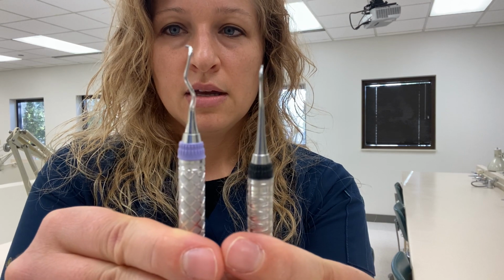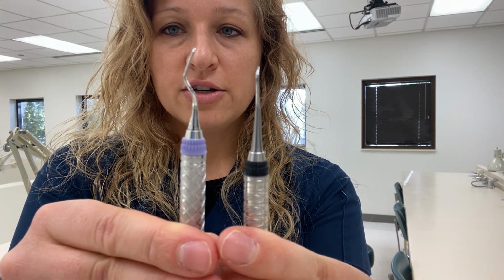If you think about it, a simple shank is not going to go over all those big parts of molars. It's not made to reach into deep pockets. It's made to get something easy, like a tooth in the front of the mouth. Whereas a complex shank, see the difference here, has a lot of bends and curves in it.